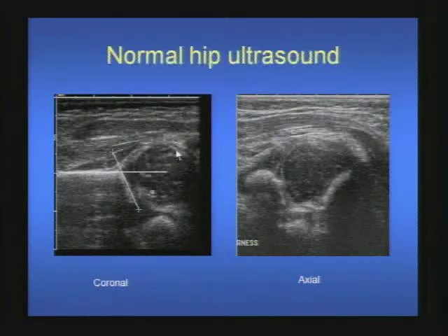This is a coronal static ultrasound image showing the osseous acetabulum and the cartilaginous acetabulum together with the iliac crest, forming an inverted Y-shaped configuration harboring the non-ossified femoral capital epiphysis. This imaging axis is used to determine the maturity of the acetabulum by determining the alpha angle, which is the angle intersected by the line tangential to the iliac crest and the line tangential to the bony acetabulum. Normal values are greater than 60 degrees.